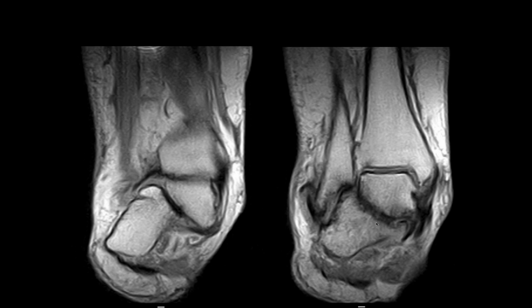You get acquired flat foot deformity, and you start getting lateral displacement of the calcaneus, which then abuts up to the distal fibula, and this is hindfoot valgus and bony lateral impingement. And this is kind of the end stage of adult acquired flat foot deformity. And that's all due to posterior tibialis tendinopathy. So it's very important to pick up the posterior tibialis tendinopathy early and try to intervene before this slowly progresses. But there are years of a lot of pain. Tendinopathy and tear, John. Yeah.